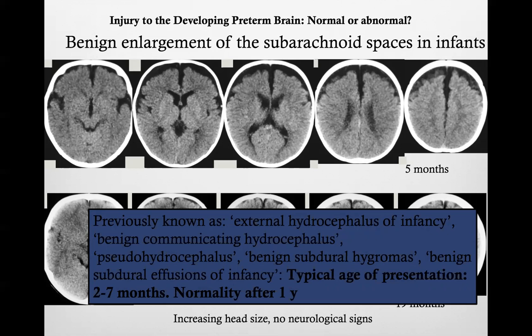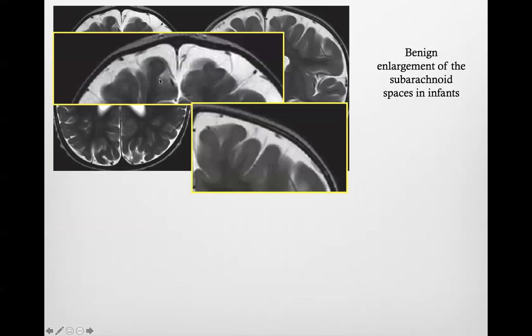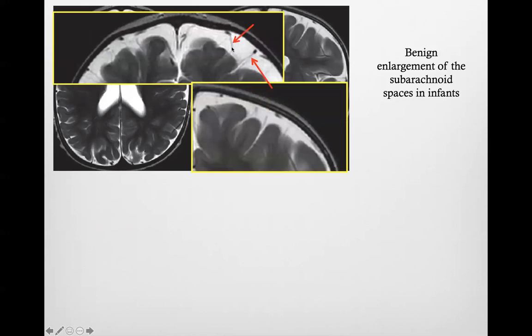This is a lecture on MRI. I want to show you the MRI aspect of this. You can see there are these small vessels here. These are bridging veins, typically part of the subarachnoid space. If there are no bridging veins, these are not subarachnoid space.